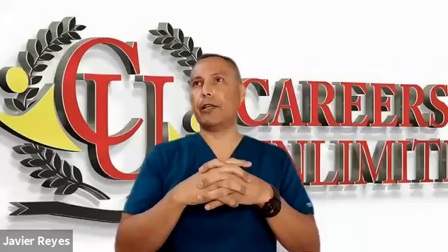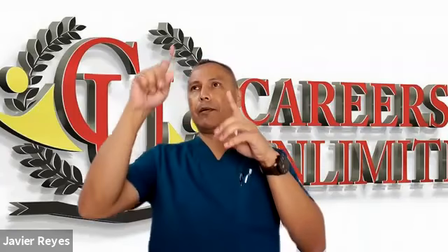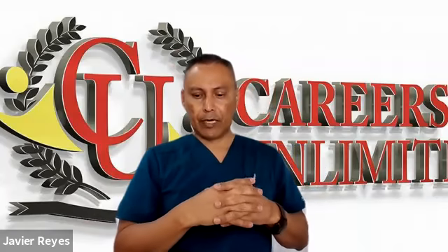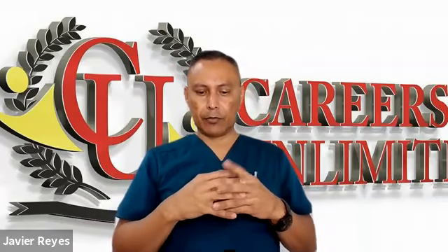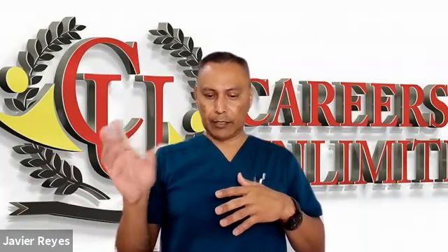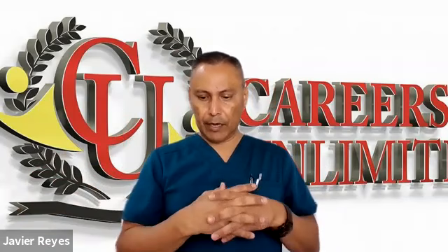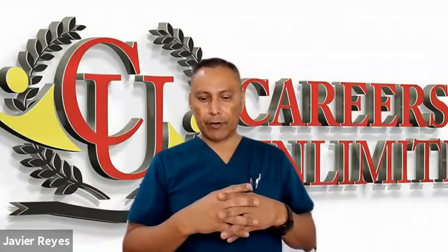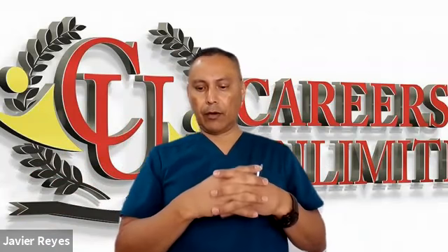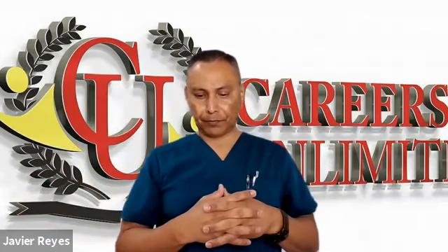Some people call it the rabbit ears because they look like rabbit ears, just two pointy peaks. In the left bundle branch block, the left conduction pathway is blocked. Current travels down the right bundle branch to cause the right ventricle, the septum, and the left ventricle to depolarize. This results in a wider than normal and negatively deflected QRS when viewed on lead V1.